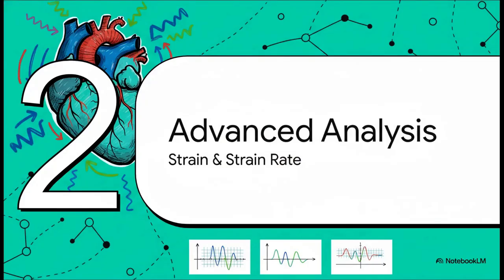Okay, so we've got those fundamental concepts down. Now let's peel back another layer and get even more detailed. We're moving beyond just measuring size and volume to look at the actual mechanics of the heart muscle, how it deforms, twists, and shortens. This is the world of myocardial strain and strain rate, and it is an incredibly powerful way to spot dysfunction way before the EF ever changes.